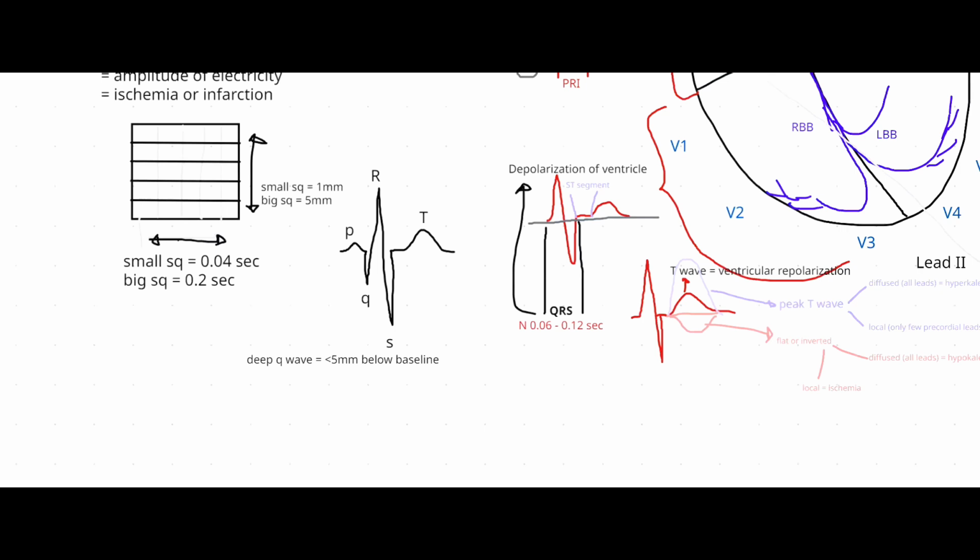This patient had a history of MI in the past. Okay, either a silent MI or a not so silent MI. Silent MI is when they get a heart attack, but they didn't know it. I meant to say lower, so -5, but yeah, greater than 5 millimeters, but below the baseline. Thank you. So that's what I mean to say negative.